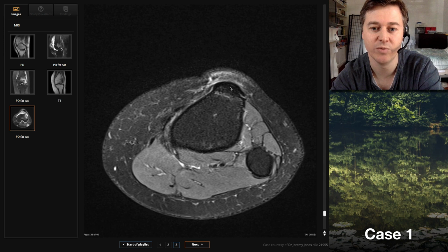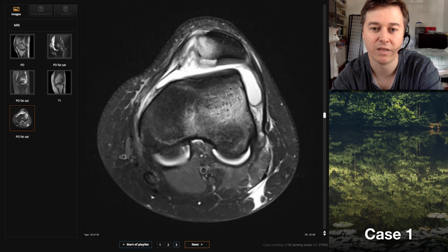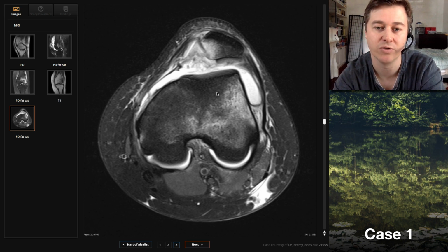Yeah, so if we go down to the tibial tuberosity here, keep our mouse in the same spot, follow it up and measure that distance across to the groove, that should be around 10 millimeters. This one's much larger than 10 millimeters. Anything more than 15 millimeters is probably abnormal, and 20 millimeters is definitely abnormal. So this one's probably at least 20 millimeters. So there is that abnormal lateralization of the tibial tuberosity, which is predisposing the patient to a dislocation.